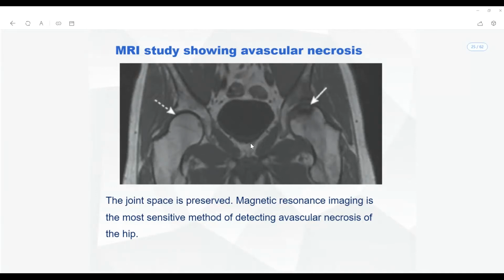When you are talking about joints, you need to look at both articular surfaces, which means the proximal part of the bone that is forming the joint, the connection formed between two different bones. Let us say here, for example, it is formed between the acetabulum and the femoral head. So at the same time, you also have to look at the orientation or the contour of the acetabulum as well.